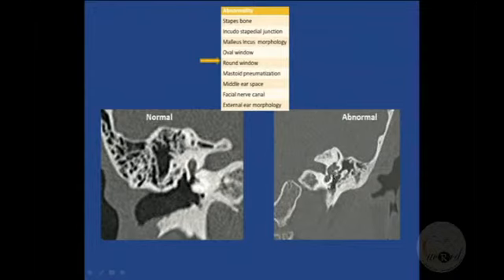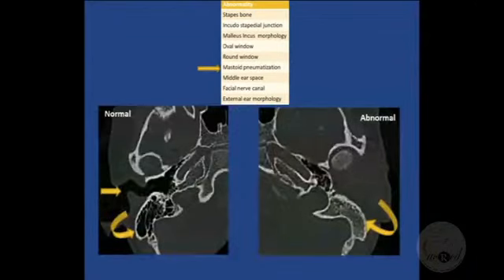And also mastoid pneumatization here. So it's the same thing, it's a combination. If the middle ear is smaller, even the mastoids are smaller. But if the mastoid is smaller, the middle ear can be normal. The association is not strong both ways. So if the middle ear is smaller, I always pay attention to the mastoid pneumatization.